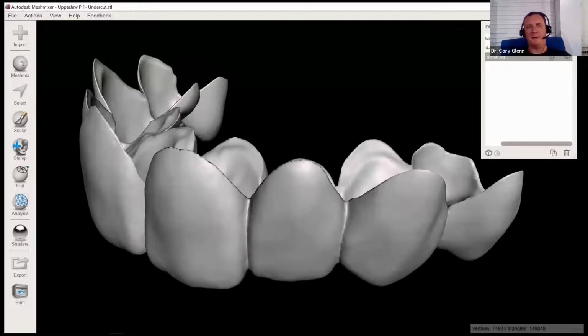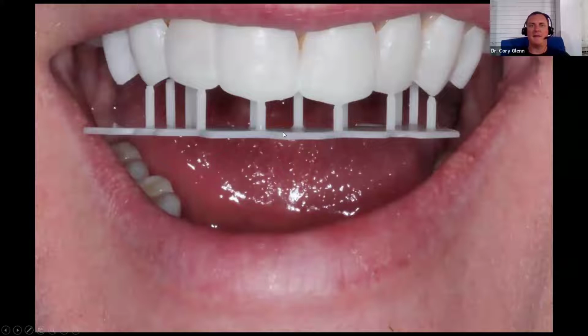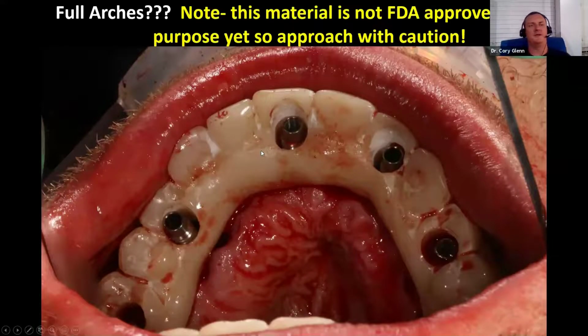So I was just playing around with this idea, and I did this on my own teeth. So these are going to be way over contoured, but I just did a wax up. I made the wax up teeth be bigger in contour than my existing teeth, added length and whatnot, and then 3D printed that after I did the Boolean subtraction. And this is straight out of the printer, slides right on over my teeth. And so, you know, I wouldn't tell someone to function on this, but if they got a wedding coming up, or I call these church teeth, you can wear them to church and no one will know you're toothless, but you don't function on these things. So that's a cool idea that you can do with this.